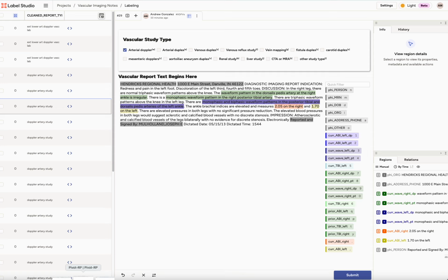Operating procedures I want to go over here. So this is an initial report of a vascular Doppler, and there are some ways that they do it at some of the more regional hospitals, which they don't do at the main campus, that I wanted to illustrate with regards to labeling and just other conventions.